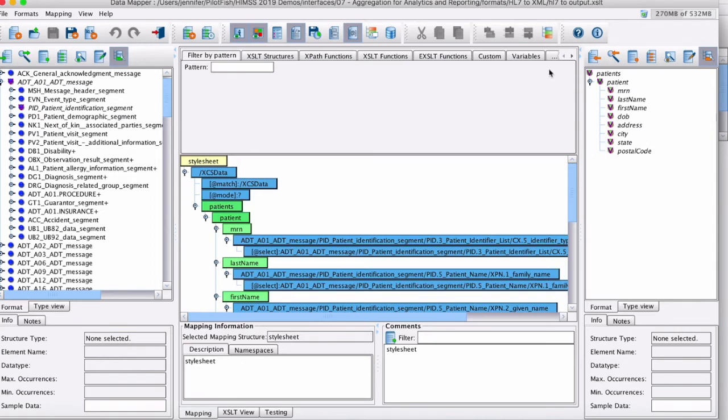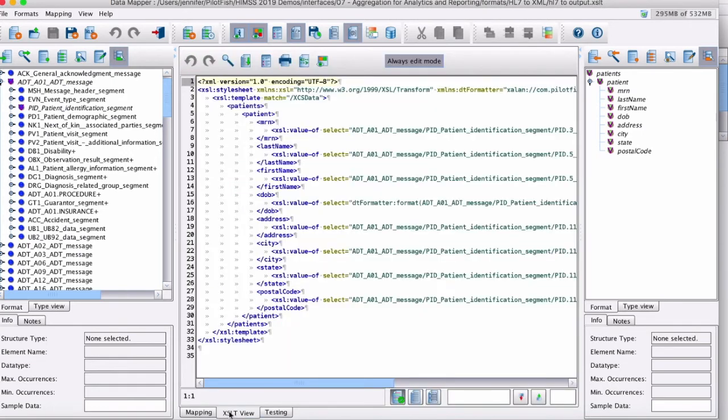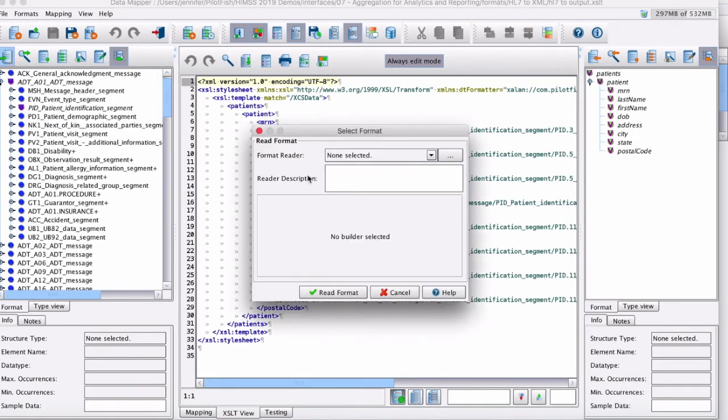Load source and target data formats, and then drag them onto the center to create your mapping. The tool is easy enough for the less technical, but backed by fully featured, non-proprietary XSLT. Note when working with the HL7, the full HL7 data dictionary is available.